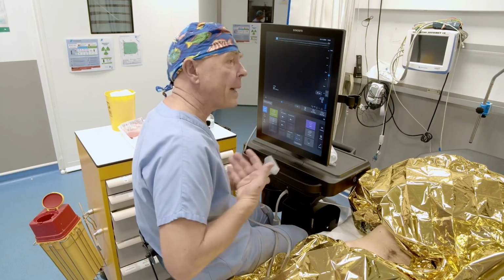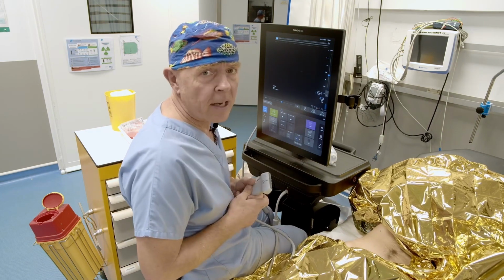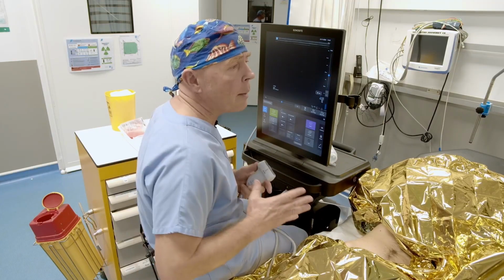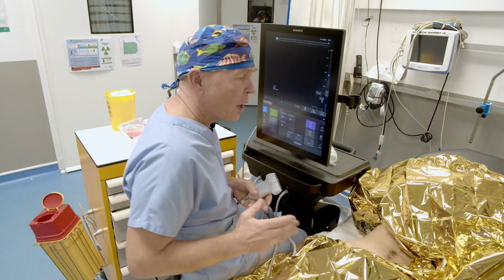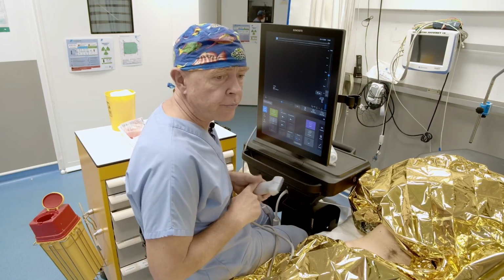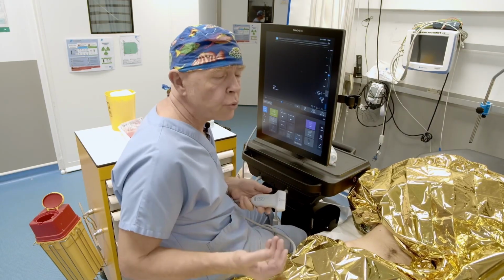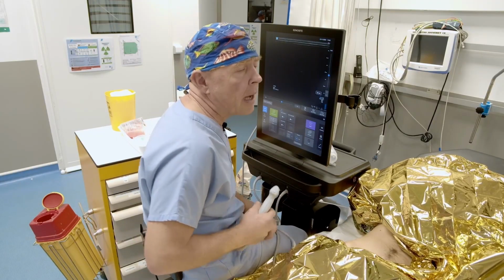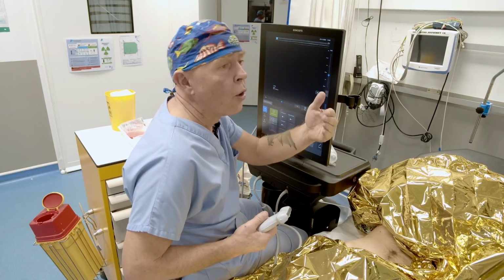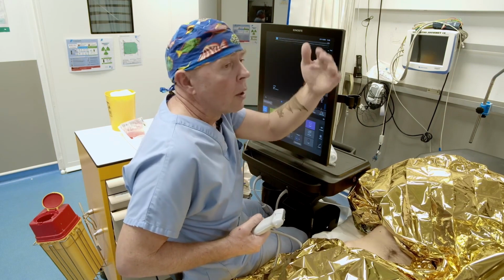A bit more intermediate, like the PECS blocks, the supraclavicular block, which isn't that easy, the iliofascial block via the suprainguinal approach, which can be classified as an intermediate block before tackling the paravertebral blocks. Quite simply because the angulation is greater. You are very close to the intervertebral foramina and also to the pleura. But it's a block that is extremely effective with an efficacy as significant as an epidural. Whether it's for thoracic procedures or for colonic and digestive surgery, with paravertebral blocks, either unilateral or bilateral.